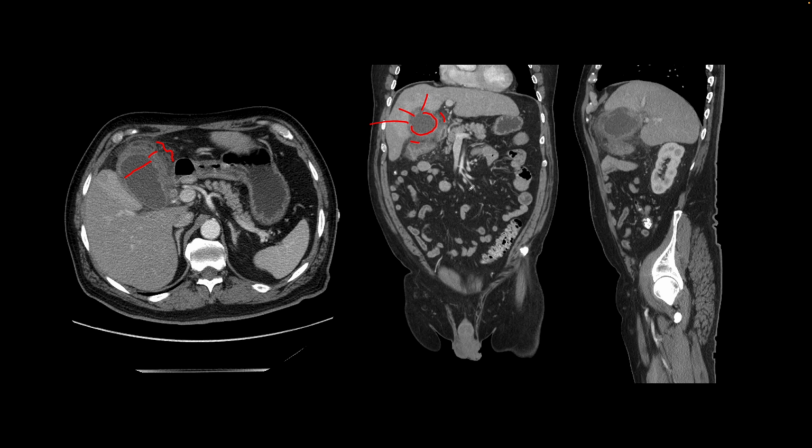And so frequently when patients have acute cholecystitis, the pathology will rupture towards the liver, forming abscess. And so we see part of that here, that there is discontinuity in the wall and there is fluid that is extending outside towards the liver. Also, you will find that the adjacent liver is hyperemic and it will show enhancement. And that's the finding we see right here. And so this patient has complicated acute cholecystitis, which ruptured with abscess formation towards the liver.